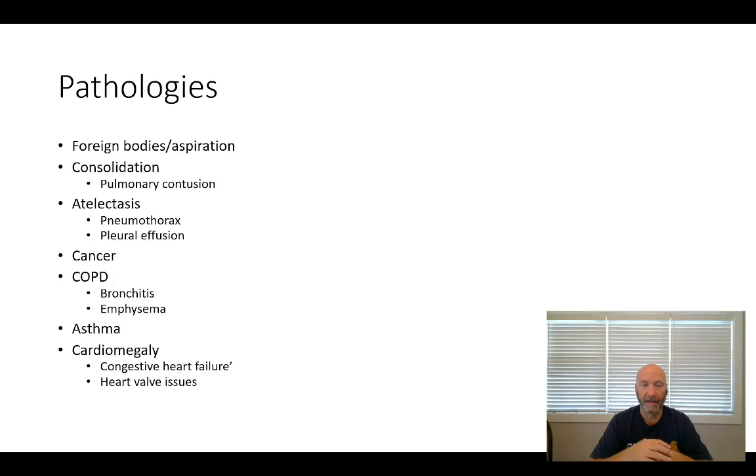And what cancer looks like in early stages, before it really becomes dense, is that if you were to take an x-ray image and you were to take a cotton ball and dip it in milk and then put that on your screen at any part in the lung, that would kind of look like a cancer. So what a cancer looks like is it's subtle and it's an area of decreased radiographic density, so slightly lighter, indicating an increase in patient density. So that's something that's going to confuse you, not cancer, but the density thing is going to confuse you quite a bit over the next couple of semesters.